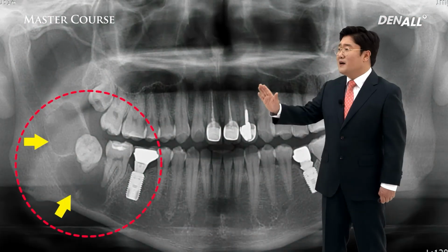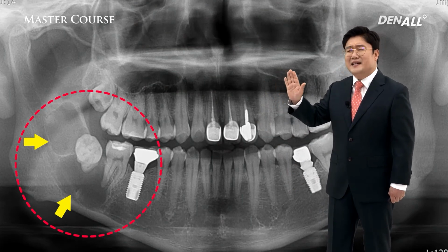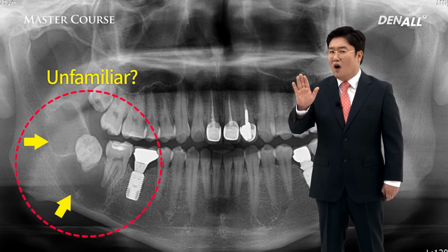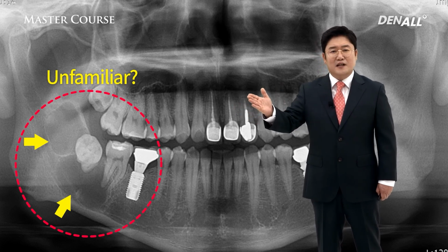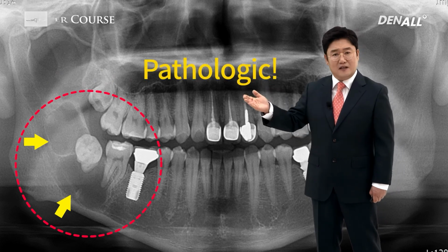If you look at panorama pictures, something unfamiliar is there. Unfamiliar structure or unfamiliar condition can be seen. Please do not ignore that. That means pathologic condition.